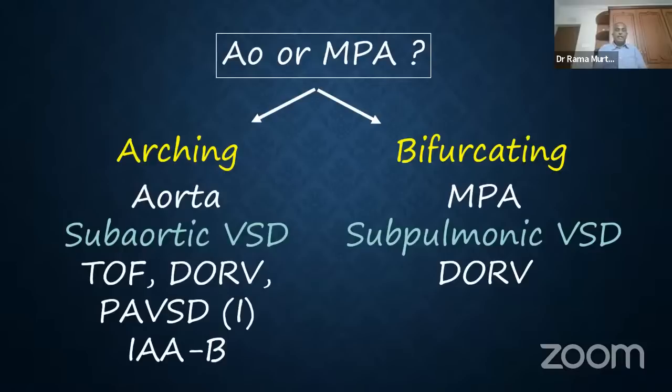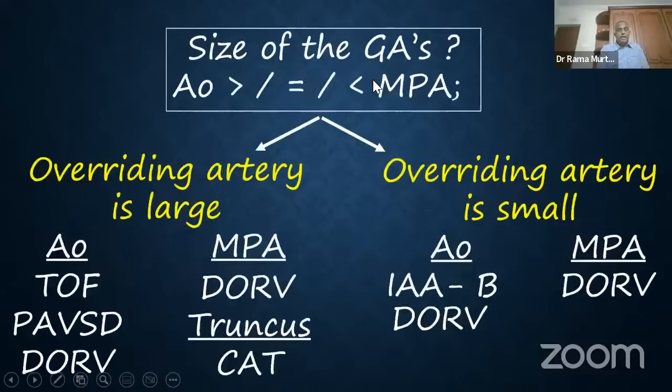So you can get a DORV where the overriding artery is the main pulmonary artery, in which case the malalignment VSD is subpulmonic. And if the aorta is overriding, you call it a subaortic malalignment VSD. So arching or bifurcating will help us to differentiate the nature of the overriding artery.